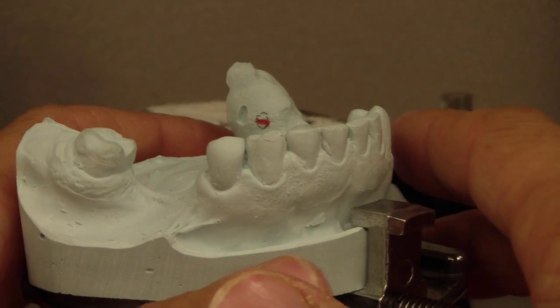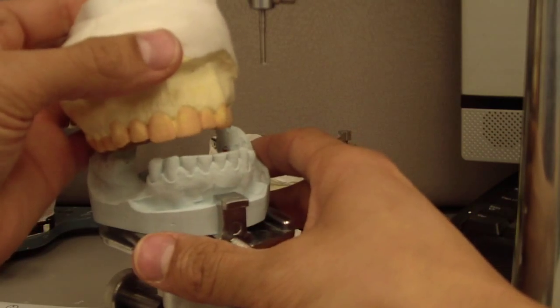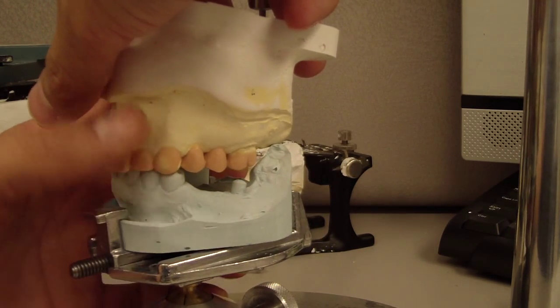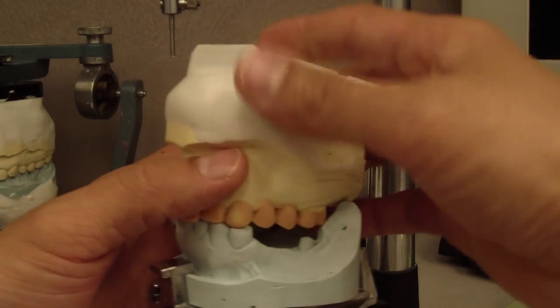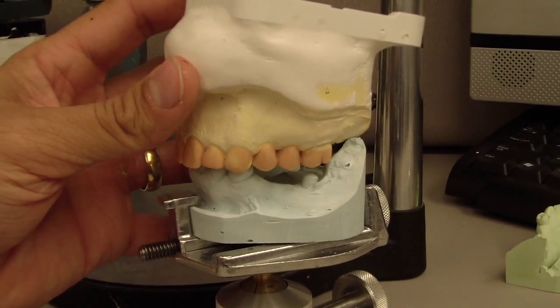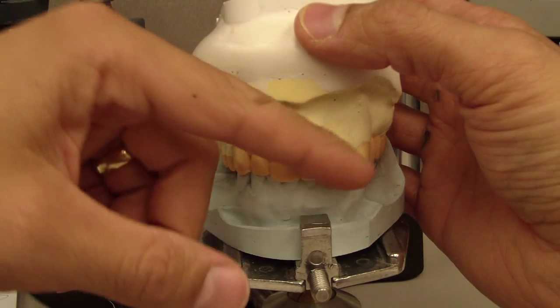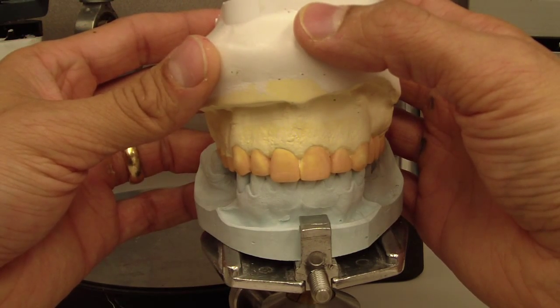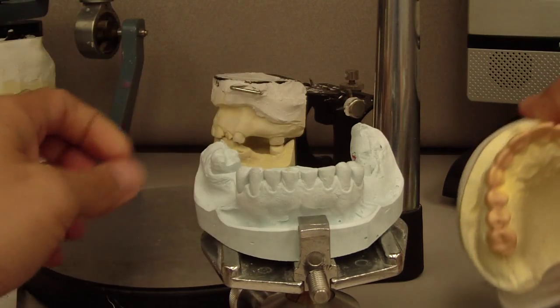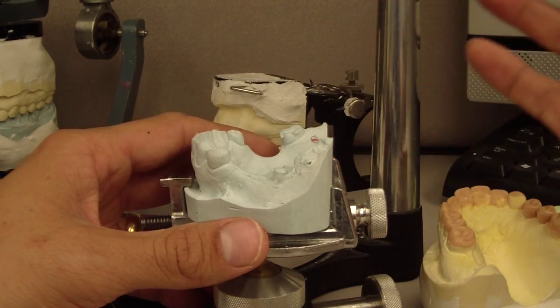So then what's going to happen is that this patient has, this is the maxillary cast. Let me zoom out here. So this is the diagnostic wax-up for the maxillary cast, and we have a series of fixed restorations. The intent now is to have a framework developed, and then we'll have the fixed restorations and provisionals right now, have these porcelain fused to metal restorations, and then once everything's set, the teeth in acrylic. And off we go. So I hope that helps in survey design for this partial denture. Cheers.